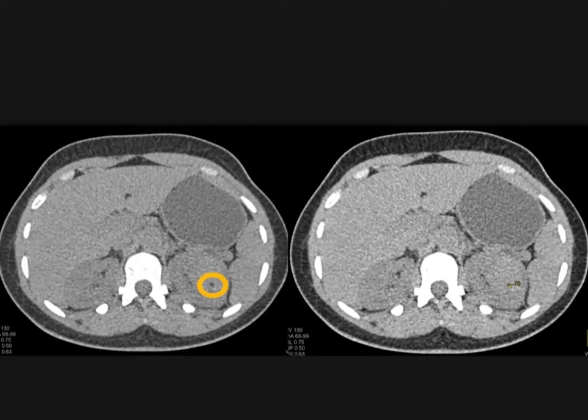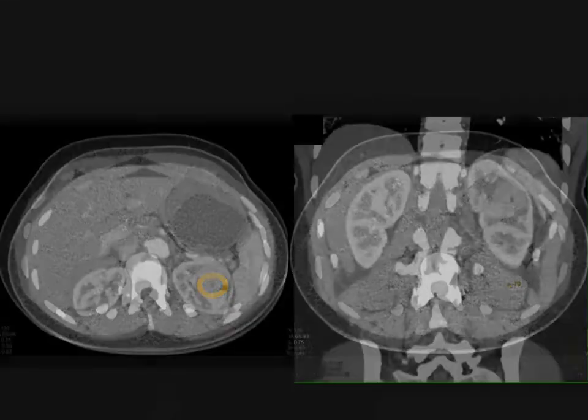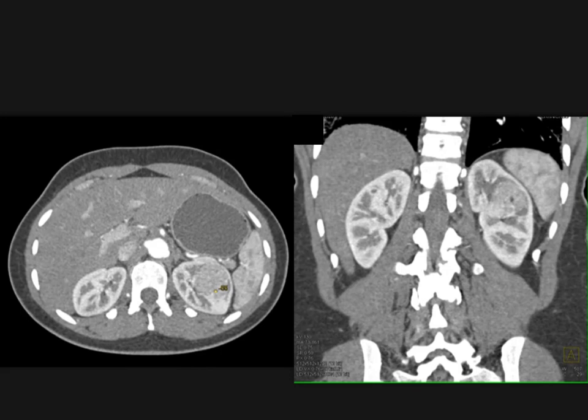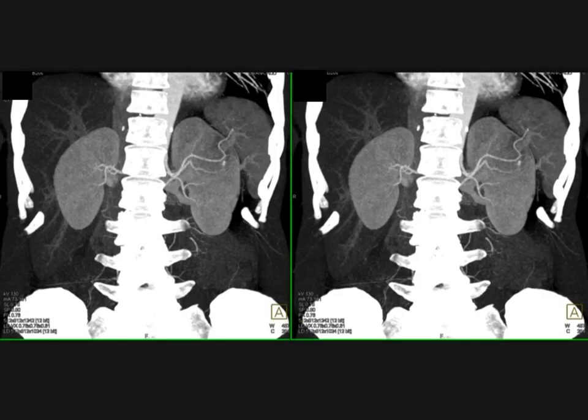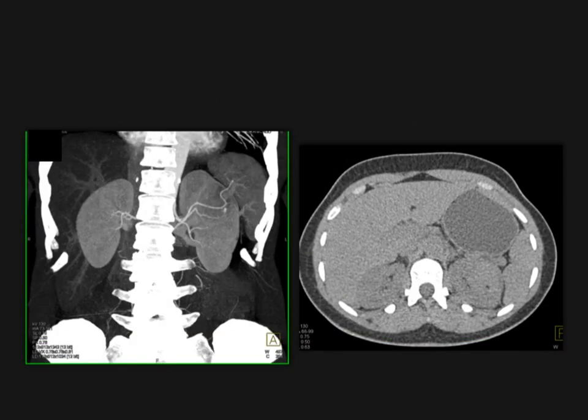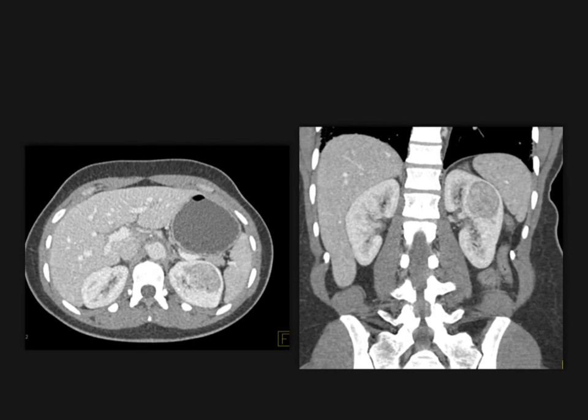That's not going to be a tumor with a focus of fat. That's not going to be the case. And you can see it in this patient as well, very nicely shown in the coronal view. And then here on the 3D mapping, you can see the areas of vascular blush, the vascular malformations, which you can see here as well. And there. And again, you can make the diagnosis. So it's a very important diagnosis to be able to make. Again, it means the patient's lesion can be treated conservatively in most cases. And surely if it's operated, you do a partial.